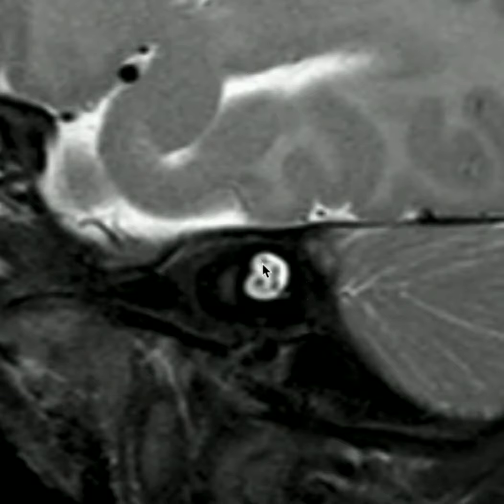Here anteriorly and superiorly, we have the facial nerve. Anteriorly and inferiorly, we have the cochlear nerve. Posteriorly, we have the superior and inferior vestibular nerves. There's a bony crest called the crista falciformis that divides the internal auditory canal, right here, into superior and inferior halves. Another bony landmark is the Bill bar, which splits the anterior and posterior internal auditory canal along its superior aspect right here, separating the facial nerve from the superior vestibular nerve.